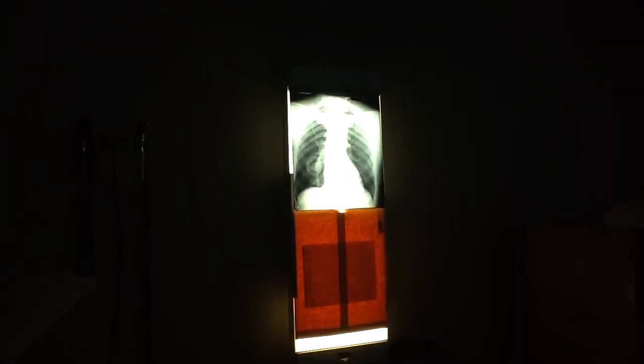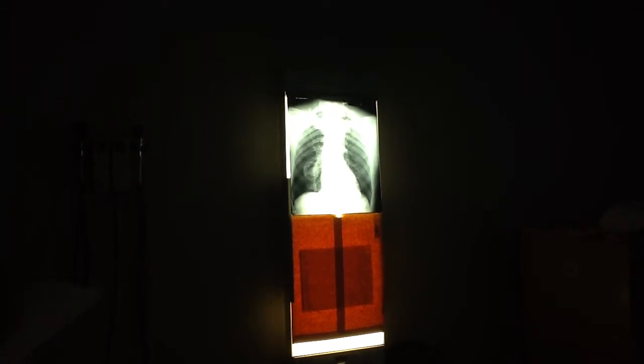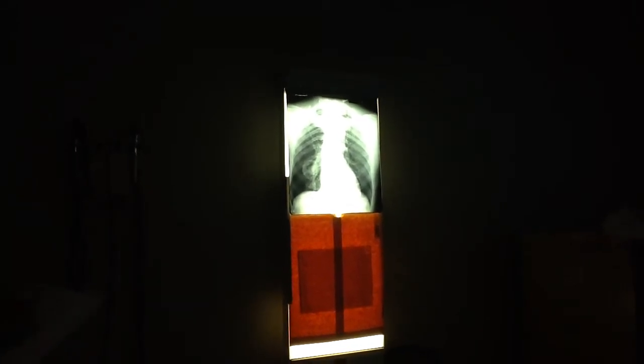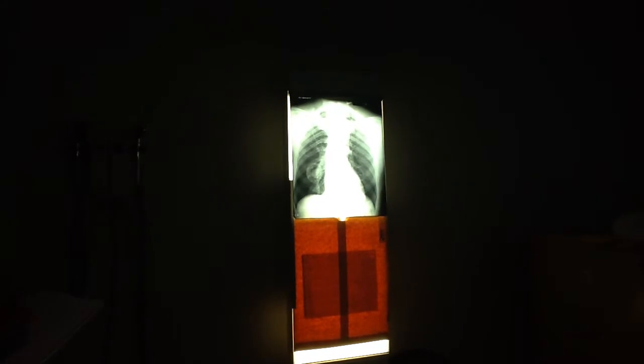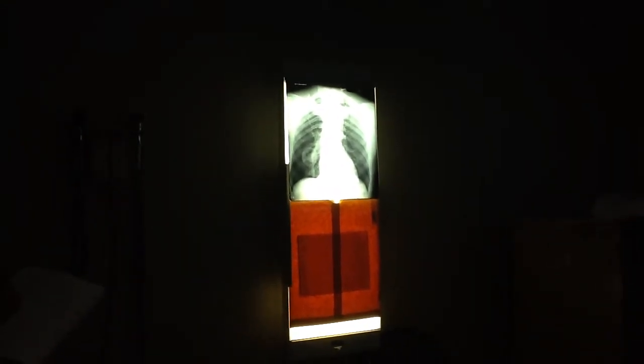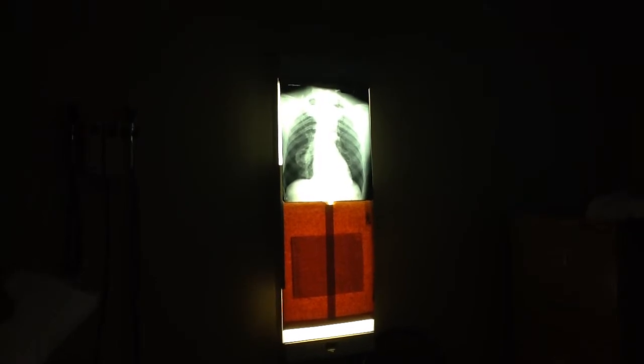If it was consolidation, how would we expect it to look? If it was a localized pneumonia. It would be more homogeneous. Less refined. Not necessarily, might be. Yeah, fuzzy, less refined. Yes, the border would be fuzzy, wouldn't it? Because if we go back and think of the 7 characteristics of consolidation, 6 and 7 are really the important ones. And number 6 says fuzzy border unless doing what? Or running up against a fissure. Unless it's against a pleural fissure boundary.